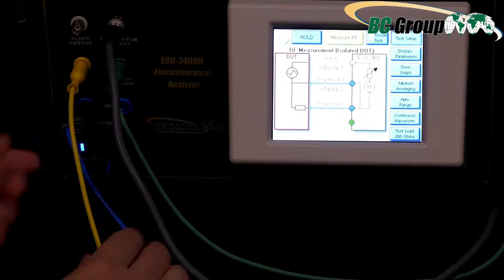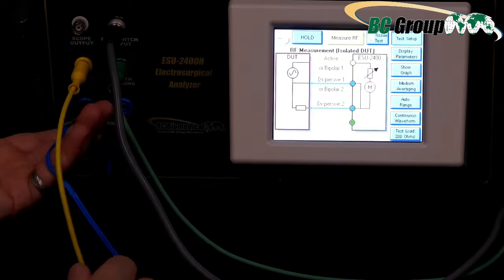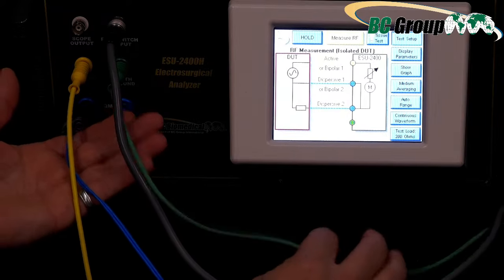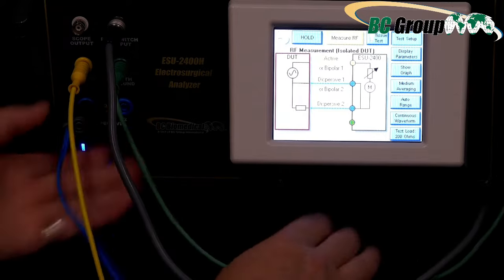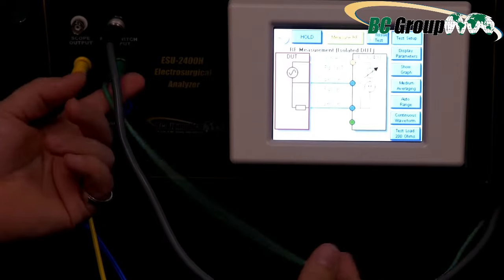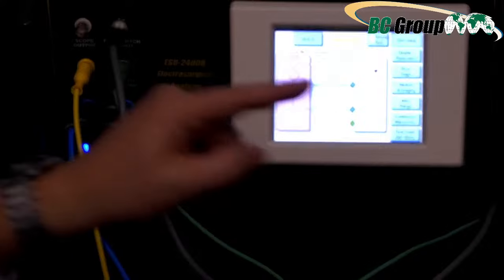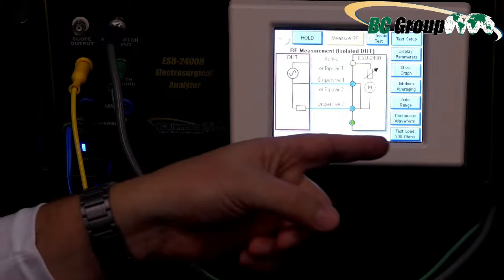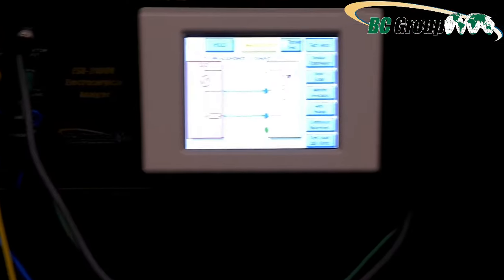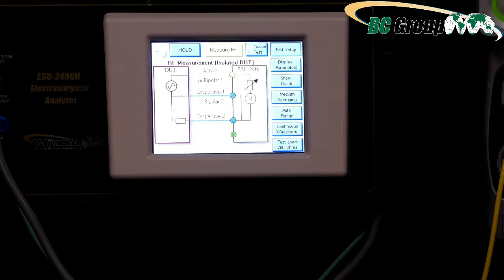See it? We have this guy here, the yellow one there, and I have a green one right here, which we will use in just a minute for leakage, but I connect it anyway just so that these two devices are at the same potential. And this ground, earth ground, is connected to the earth lug, which we normally do electrical safety measurements on the back of the FT10. That's where it's connected. So let's go back over to our menu.